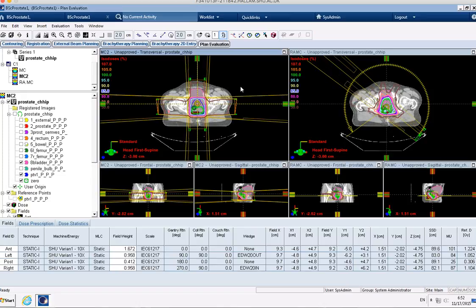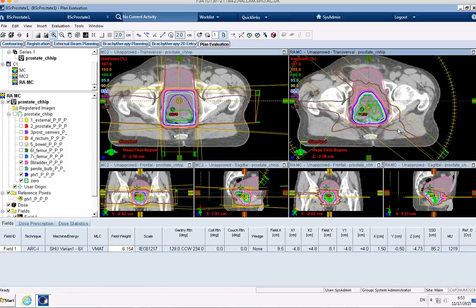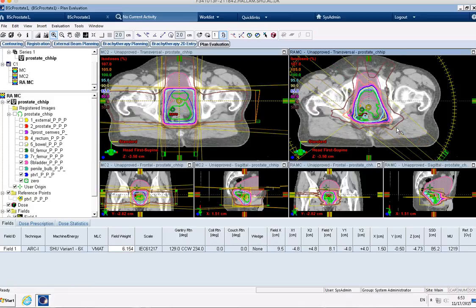So we can see there the difference between the dose distributions on those. And again, we can zoom in at particular points, and we can see here about how the plan conforms. So we can see here the 95% isodose conforms quite nicely there to the PTV, but for instance we can see there that we've got those triangles because of our 4-field brick, and so we could work our way through that on each slice and comment on that as well. So that's another way of comparing the two plans. What we could do, we could then maybe go back and optimize them further if we decided that one was almost there but wasn't quite.